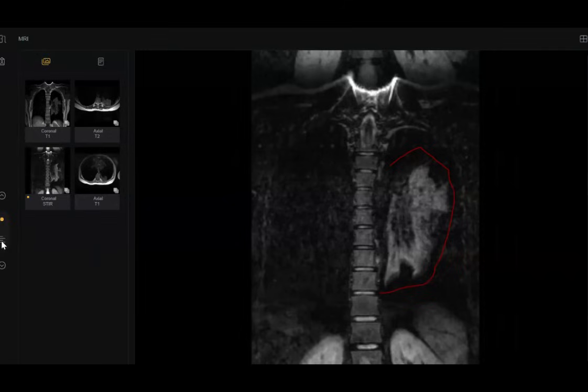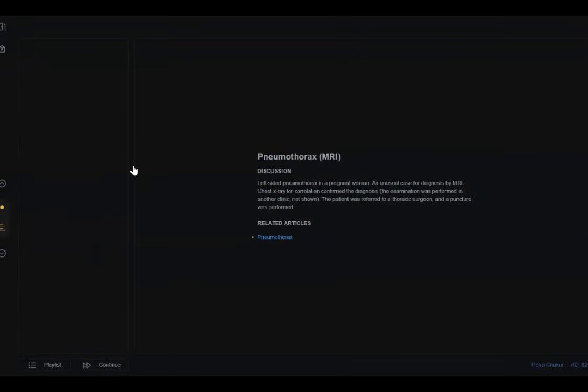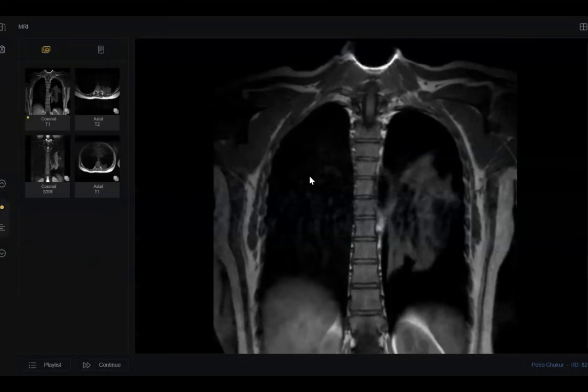Thank you, Dr. Rami. What happened here, my colleague? Very difficult, by the way, and in my opinion, give many possibilities because it is a very difficult case. Because if I told you there is no bronchovascularity here. Also here, you can't detect well, except this line, other bronchovascularity. But overall, the only suggesting sign is that all the lung is collapsed towards the center.